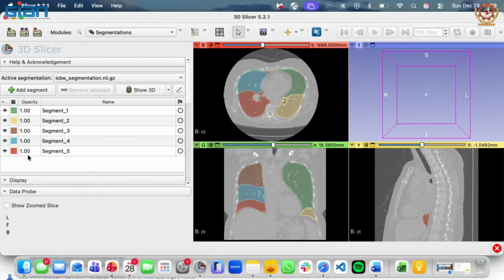Or sometimes what happens is you take the lung out. In that case, you might have a different number. But for a normal lung, you should have these lobes. A big tumor can take a significant part out, and small cell lung cancers are generally very big. So, okay, everybody is here. This segmentation 1, 2, 3.